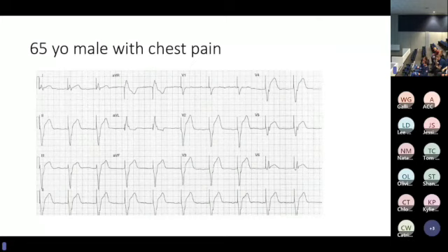aVL looks a bit weird, doesn't it? But it is, I guess. But yeah, I think I probably would activate based on that. Any other takers?